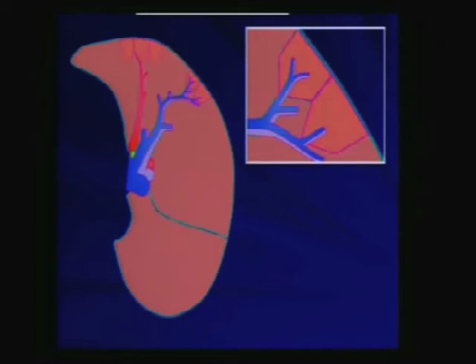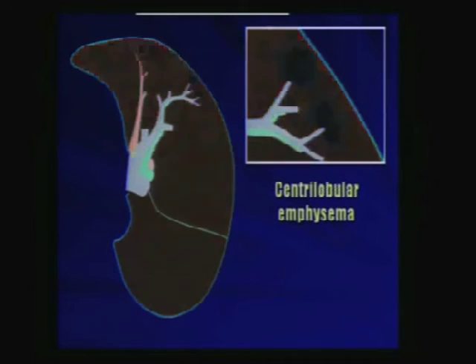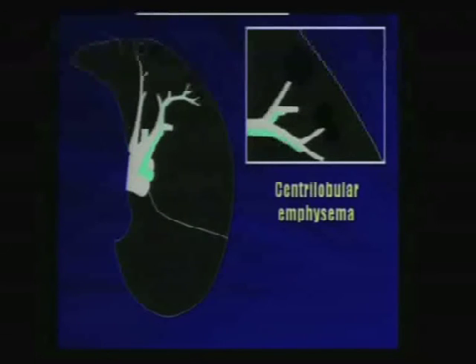And the best example is going to be a patient with pulmonary emphysema, centrilobular pulmonary emphysema. And I don't know how prevalent it is here in Lebanon, but obviously if there is a high prevalence of cigarette smoking, that's something that you're going to be able to see. So one thing that you need to recognize about centrilobular pulmonary emphysema, besides the fact that it does follow the anatomy of the secondary pulmonary lobule, is that most of the time those cystic changes do not have a definable wall, in contrast to other diffuse cystic disease such as lymphangioleiomyomatosis or histiocytosis and so on.